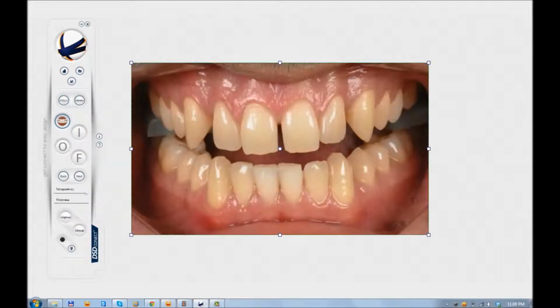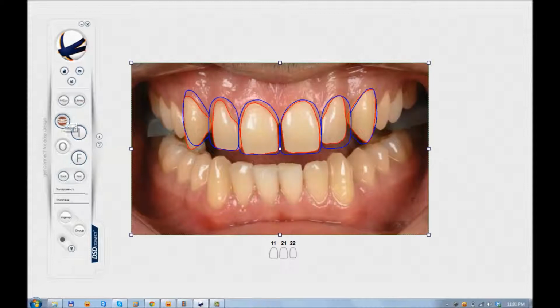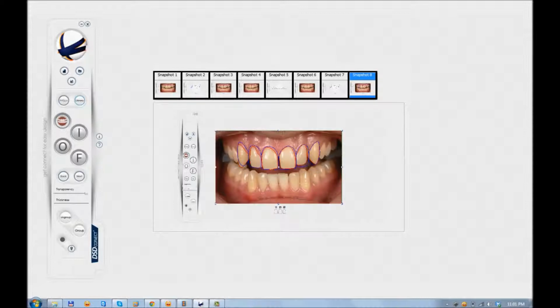Accessing this button, the application will capture the image print screen anytime it is wanted, obtaining useful information in the case of interdisciplinary communication. If you want to visualize the print screens, you access the Library button.